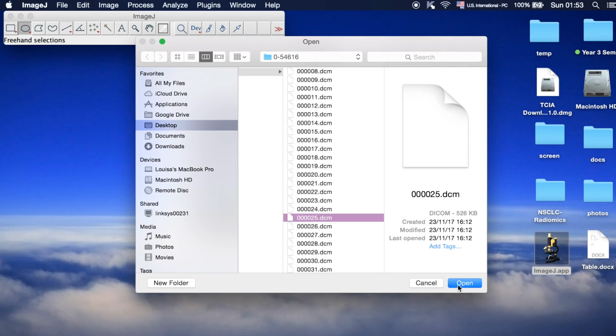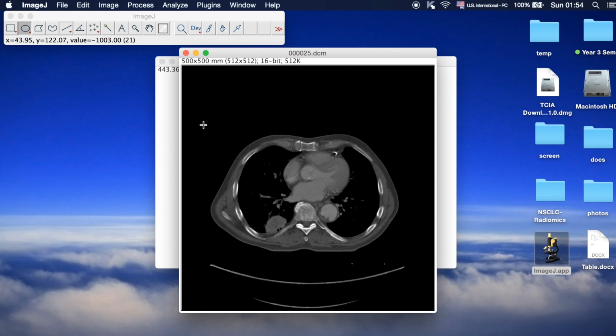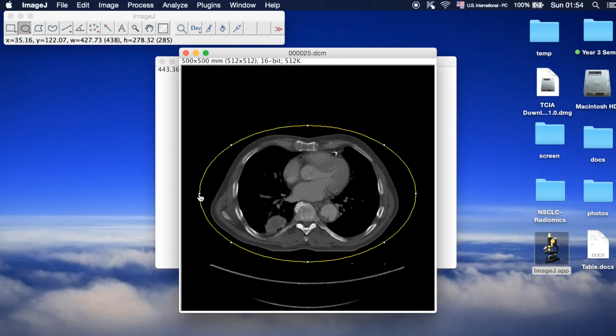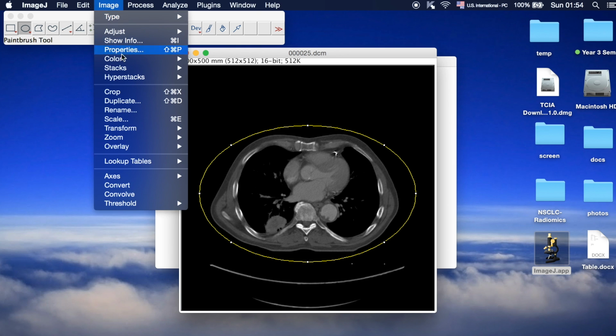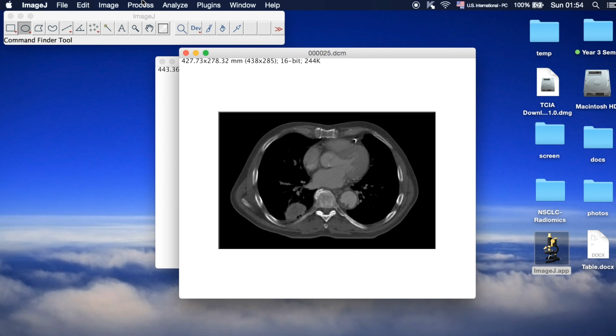Upon the discovery of a space-occupying lesion on a plain chest X-ray, a plain CT was arranged to assess the size and the location of the mass. An elliptical field is first selected to exclude preventable artifacts such as the CT couch, then we crop to only see the pixels within the region of our interest.